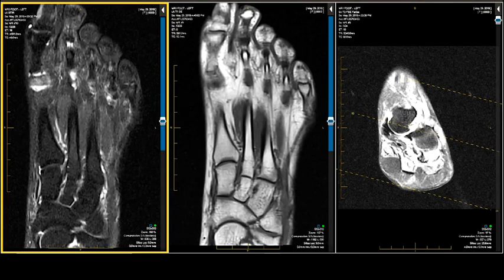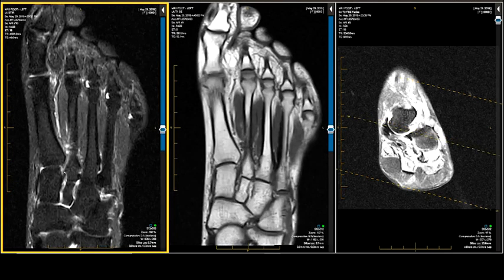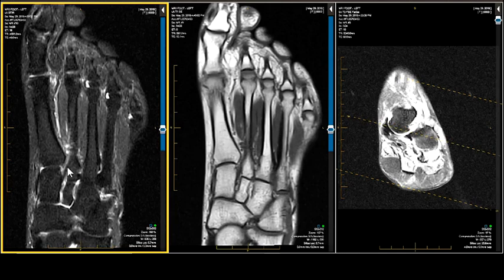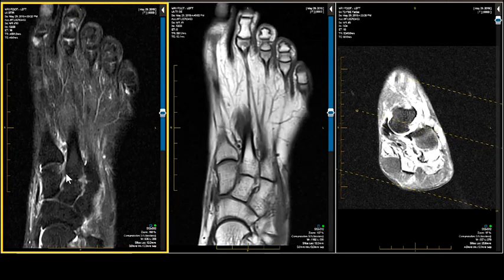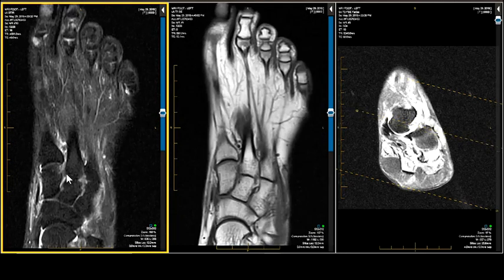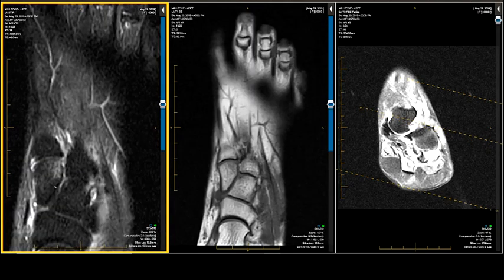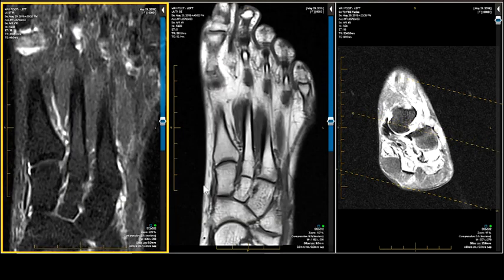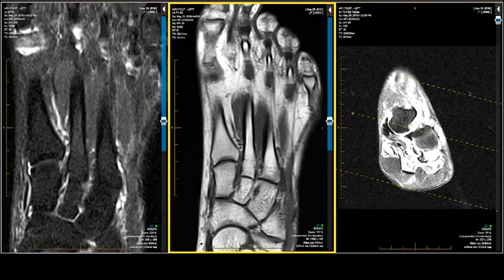Well, on the water-weighted image, the Lisfranc ligament looks pretty good. Still looks pretty good. Doesn't look so good there. There's a little fracture right next to it. Let's blow that up a little more. Could it be that I would show you 3 of them in a row? Would I be that skullduggerous?